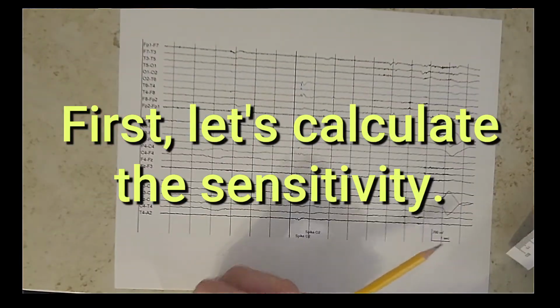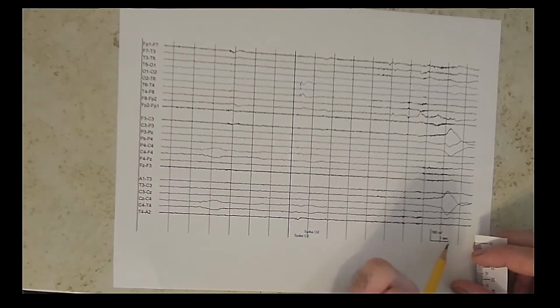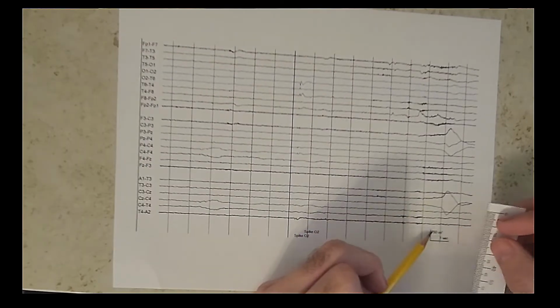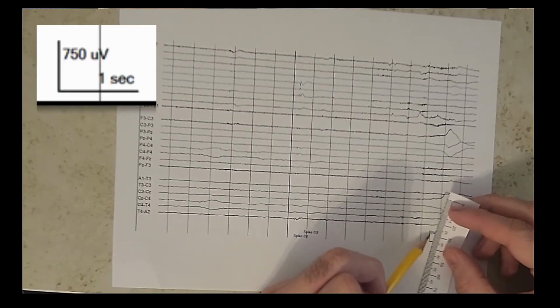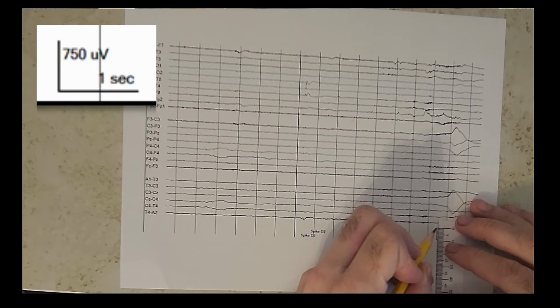So I'm going to look at my scale legend. I'm just going to look at the vertical component. The horizontal component, where it says 1 second, is for measuring the time base. So it's really two different things. The vertical component is for measuring the sensitivity. So I'm going to line up my millimeter ruler and measure the whole expanse of that vertical line.